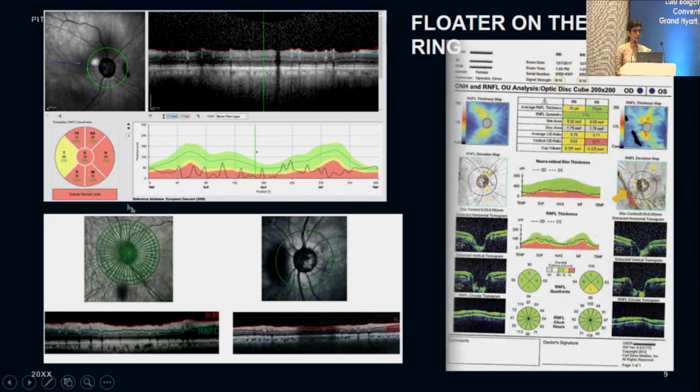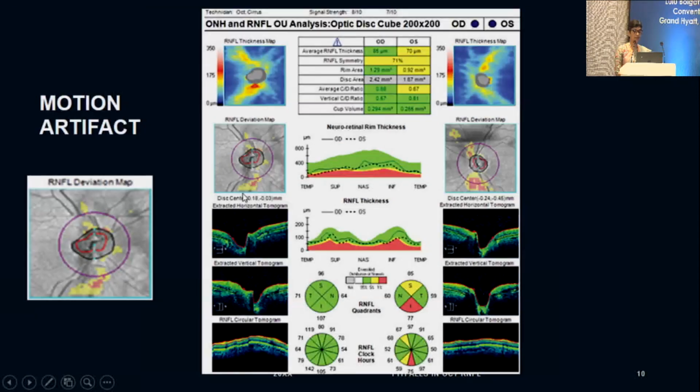Thirdly, in the printout, we must also look for the area just under the measuring ring. You can see a black area here. This prevents the acquisition of image in this area, and so you can see there is no image acquired in this area. This is touching the x-axis.